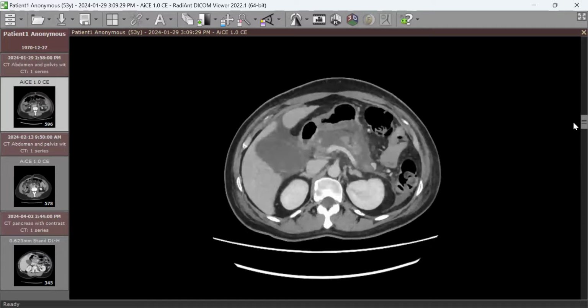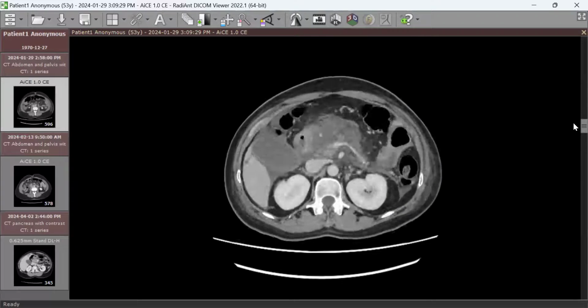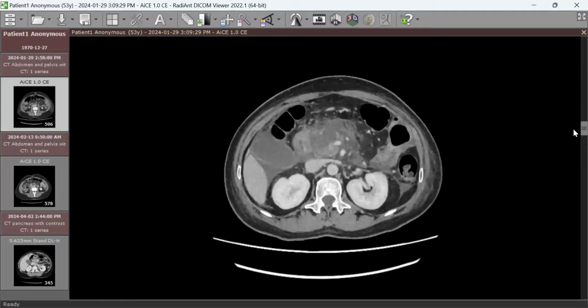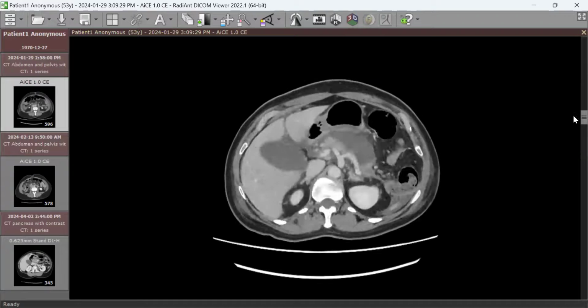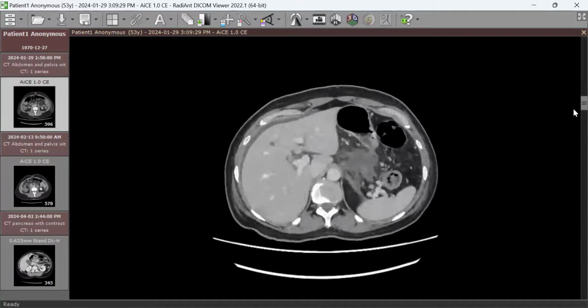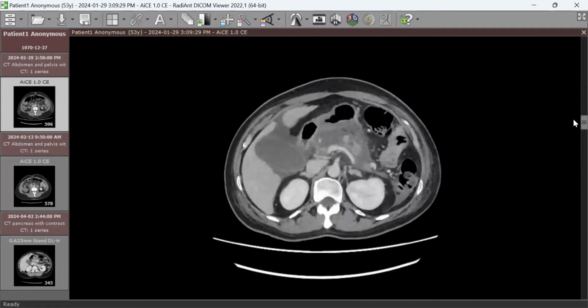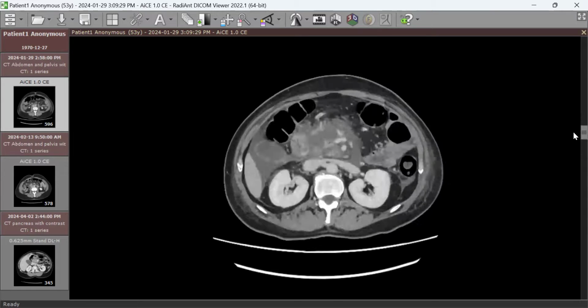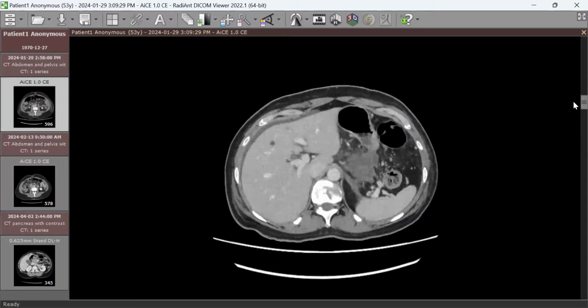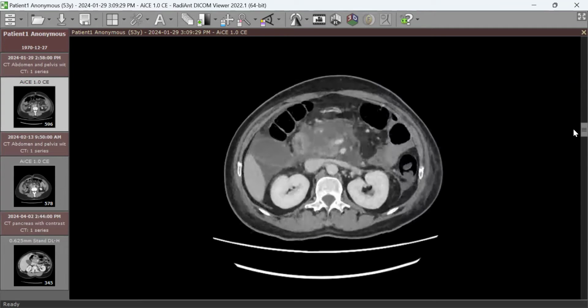But we look at the pancreas after a few days of presentation to differentiate between the two types of acute pancreatitis, right? To see if there is necrosis or there is no necrosis. After 3 days, mainly at 1 week, because at this stage, as for the patient here, we can differentiate between non-enhancing pancreatic tissue and the edema that might be present in acute edematous interstitial pancreatitis. So in this case, we have necrosis, right? Yes.